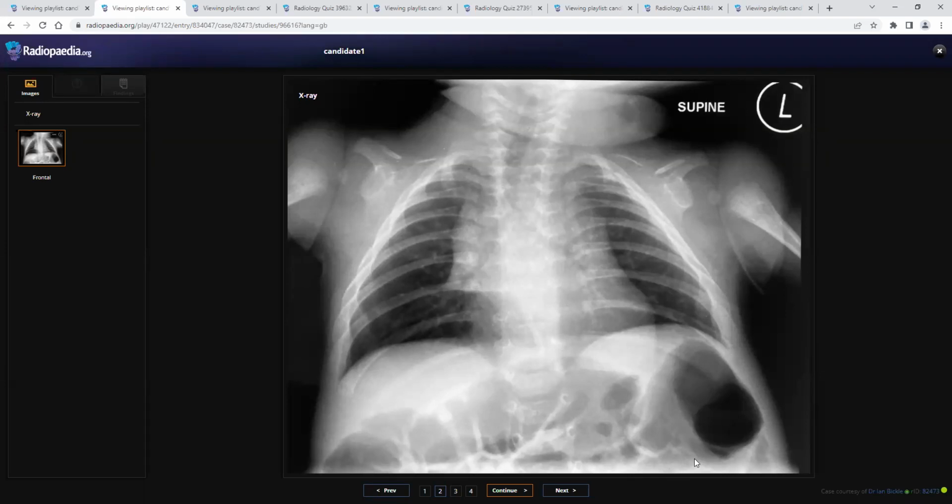So I didn't appreciate significant abnormality in this film. Okay. The clinicians are suspecting some congenital bony disorders in the child, as it is evident in the parents also. Bony problem.